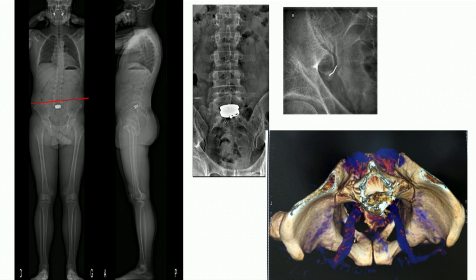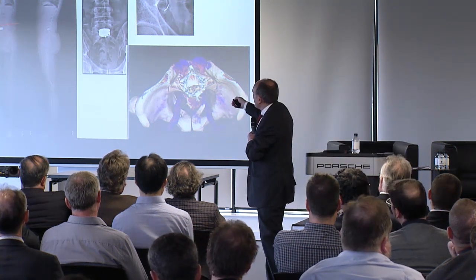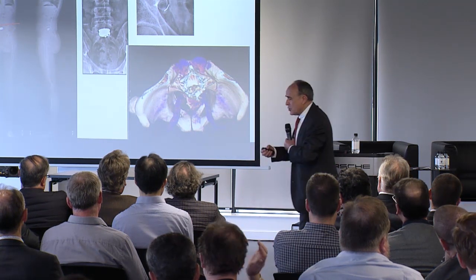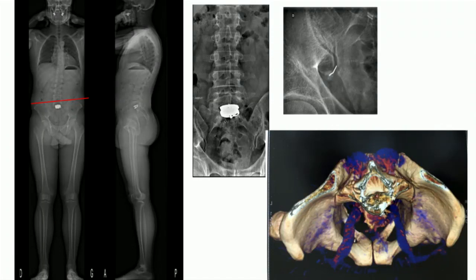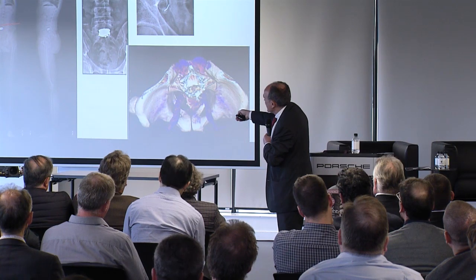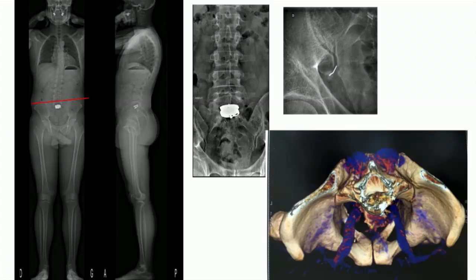So we were a little bit disturbed by this. We used wedges in the shoes, no results. And we did sacroiliac joint injection, facet joint injection to try to understand. And the facet joint injection was positive despite no abnormality on the CT scan, so they seem to be normal. And this X-ray was very surprising for us, you see, with apparently some discrepancy between the position of the superior and inferior end plate. We mainly look at the lateral X-ray, but AP X-ray is also something interesting.